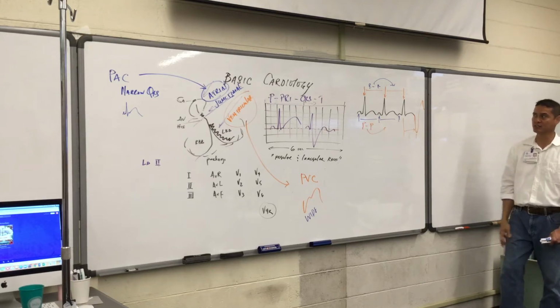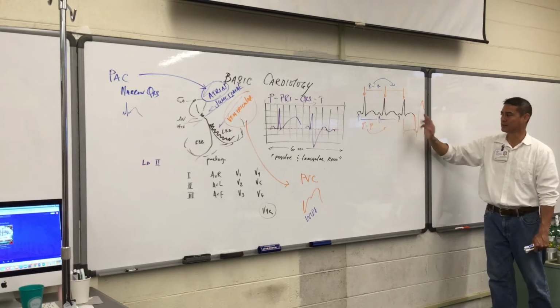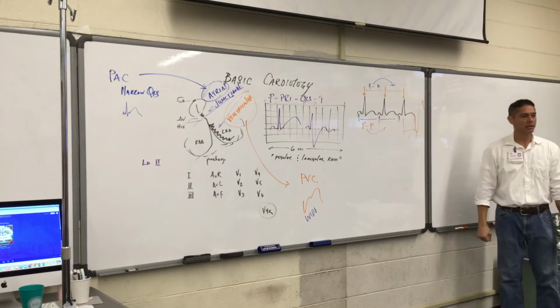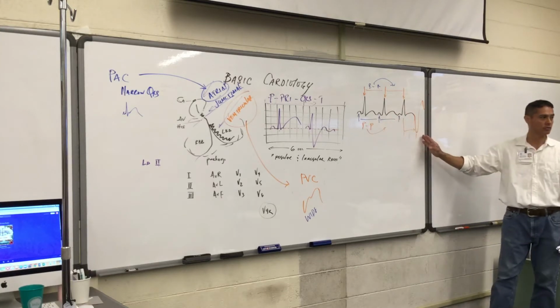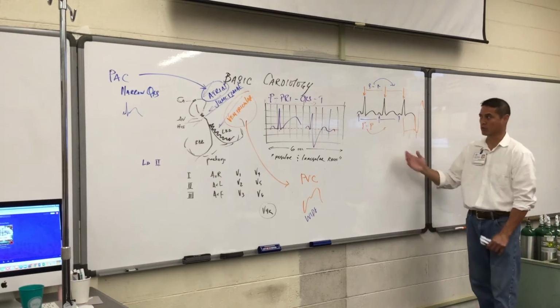Now the configuration, when you see it, it could be like 2 on 2, like this wide one, 1, 2, 3, 4, then a wide one and 1, 2. So it can change, but overall we're having 6 of these and 2 of those. Overall rate. So it's not the best, but it's an overall rate.